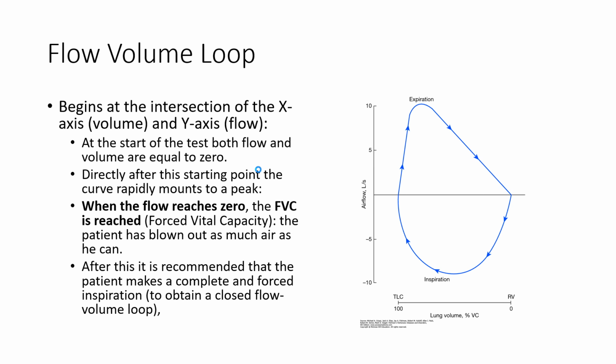I wanted to spend a little bit more time talking about these concepts, just because the flow volume loop and the time volume curve are what we make our assessments from, and I want to make sure we have enough time dedicated to that. So the first plot we'll look at that is provided from an FVC maneuver, or any PFT of any kind, is the flow volume loop.